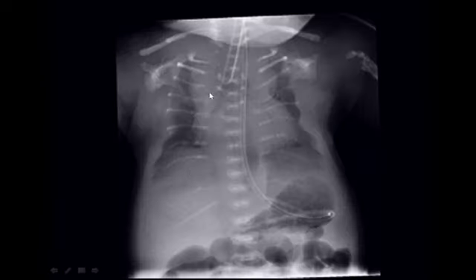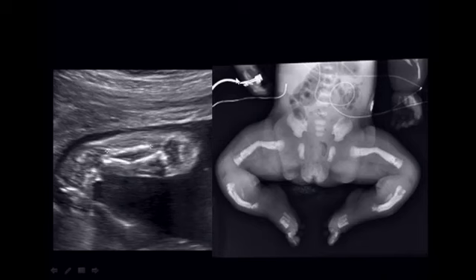Here's a chest radiograph of an infant recently born with that diagnosis, and you can see how incredibly thin and gracile the ribs are. The vertebral bodies are ossified, but not heavily calcified for an almost term infant, and the scapulae are small and moth-eaten. The humeral head and neck is very poorly mineralized. Here's an example of that moth-eaten appearance of the bones.